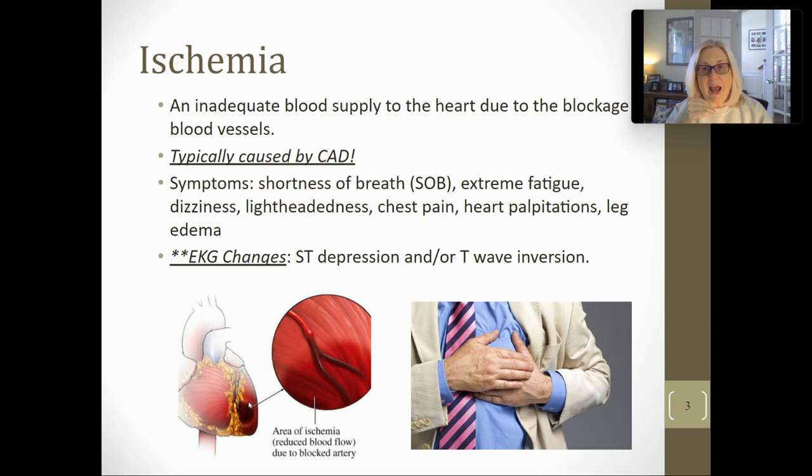Now, if it is depressed, that means that that ST segment is going to be lower than the isoelectric line. I'm going to say it again. Think about what I'm saying. So that ST segment, that little piece from the S over to the T, is going to be lower than the isoelectric line. Okay. I'm going to show you a picture in a moment.